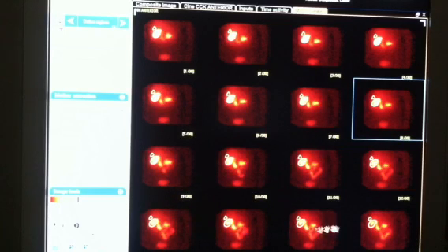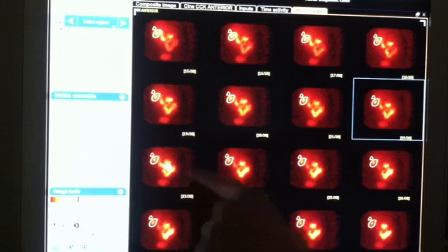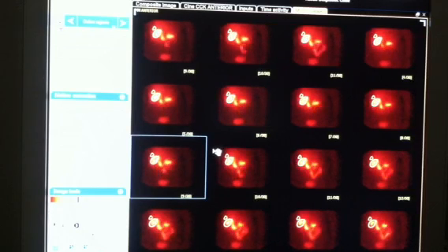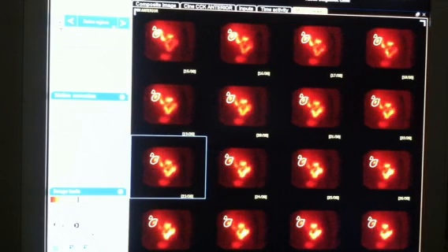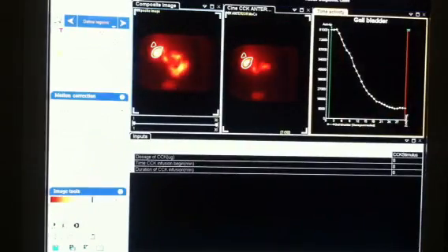And I'm going to check each one. I'm going to scroll using my mouse wheel all the way to the end and see where I'm at. And I'm going to move this one just a little bit, just to get the last few in that region of interest a little bit better. There we go. You can wheel through, make sure you like all the images, and then hit apply right there. Alright, so it's going to get us a nice smoother curve here.